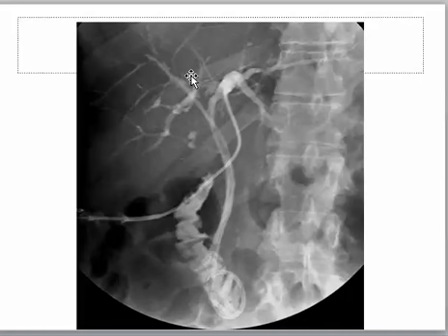So we have the biliary radicals narrowed, and this narrowing of the biliary radicals is seen in cirrhosis, in METs, metastatic deposits in the liver, and in autoimmune and Budd-Chiari syndrome.